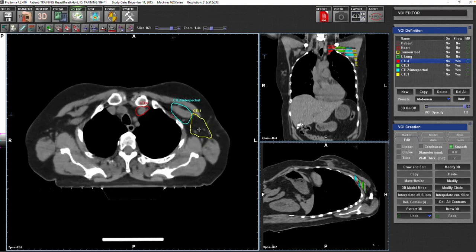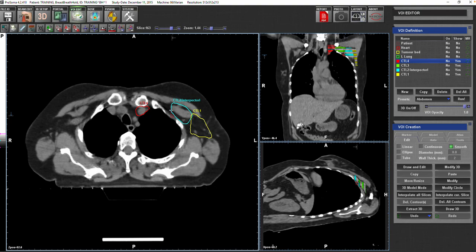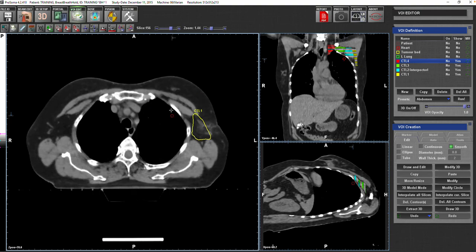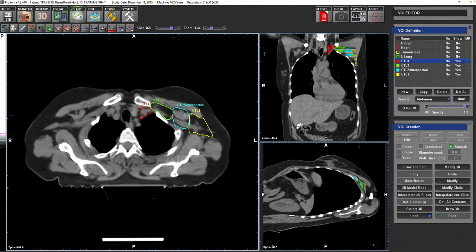Also for the physics team, when you put a structure there for them or a target for them, they will see, oh, it's not very well covered. Would you like me to use a 10 MV, Dr. Haddad? I would say, yes, use it. Or I would say, no, that's fine. If you see that the coverage is with 80, 82, 85%, I'm happy with that. And we usually shouldn't change it.